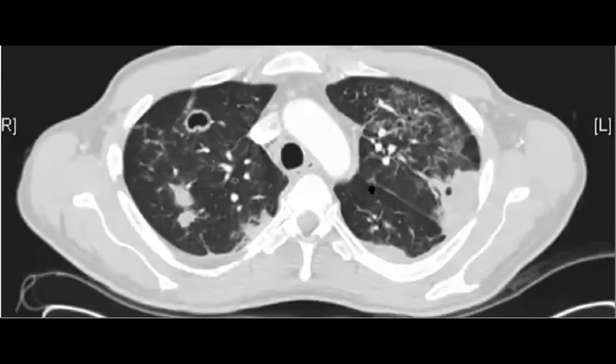Maybe septic. If the patient has any symptoms of bacterial infection, or Staph aureus or Klebsiella or whatever, so you have a source of infection, or TB, sure. Maybe multiple pulmonary infarcts, and COVID-19 will be one of the nice differentials that you can put, Nermeen, nice. And if it is infarction, you will search for any pulmonary arterial dilatation. Yeah, that makes infarction more likely as well.